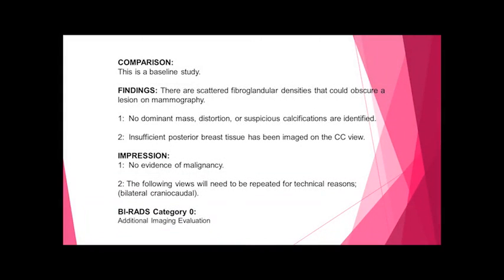Okay, let's look at the next case, a baseline study. So there's no comparison. Findings: scattered fibroglandular densities could obscure lesions in mammography.